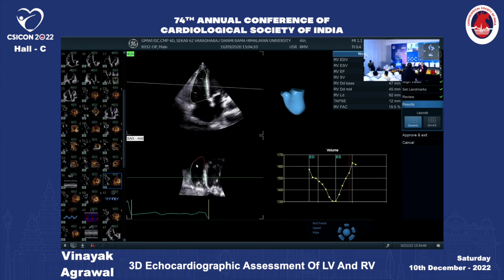How to avoid it? No, you don't avoid it. You just don't let them trace this one. Let them trace this one rather than that one. You cannot avoid it, but you don't trace that one. Trace the other one behind it. That's all.